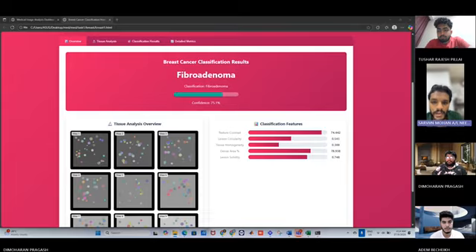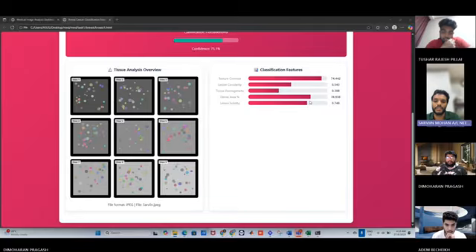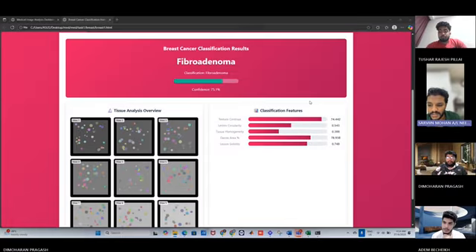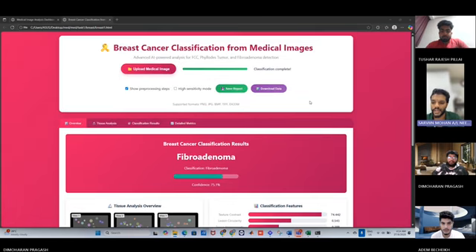As you can see, there are multiple metrics as well in this GUI to provide the user with a more in-depth understanding. While this method is fast, lightweight, and interpretable, it is limited when dealing with noisy datasets or complex medical images where handcrafted rules may not generalize well.